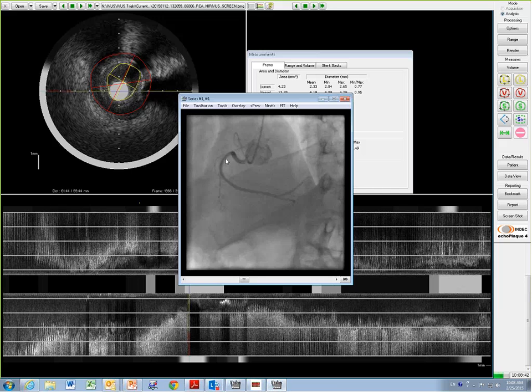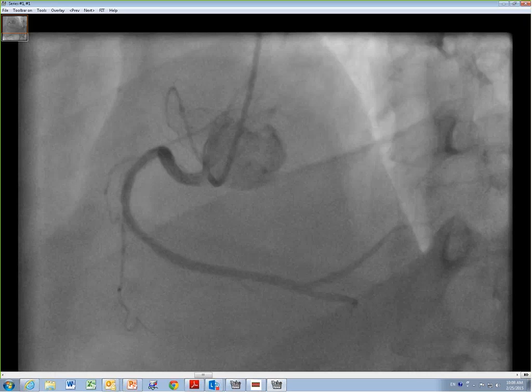So let's assume this is the small artery where we can decide to put the BVS. What we see by IVUS is somewhere here. Using this landmark, you should consider putting the BVS from somewhere here. This is just like regular IVUS interpretation: how to land the stent without knowing the unclear angiographic stenosis, and how to correct it.